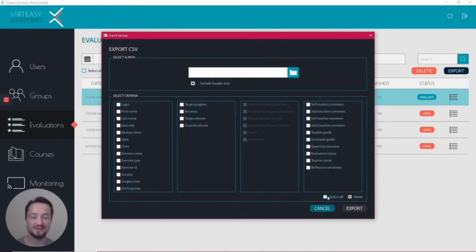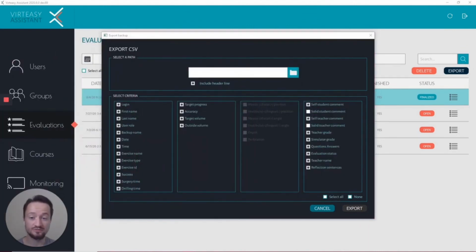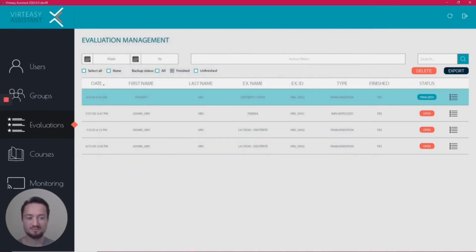And if we want to, we can export all of these results in an open CSV file so that we can integrate it perhaps with our own systems that we use in-house, or use them for creating reports for students and similar sort of things. So here we go ahead and export the CSV.